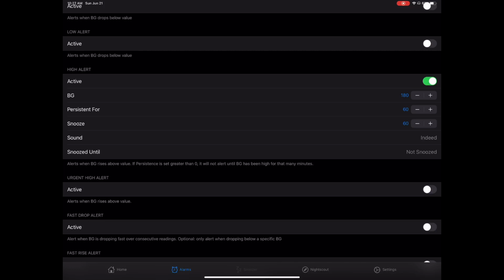So this doesn't require that every reading between those times is over 180, because if both of those start and end are, even if you're slightly dipping below it, it's probably a time when you want to trigger the alert.